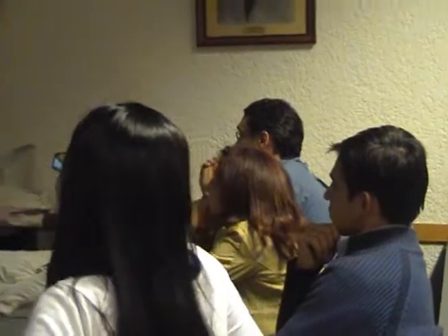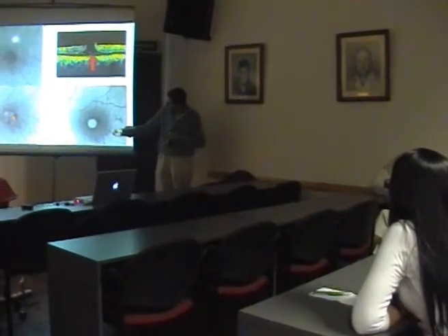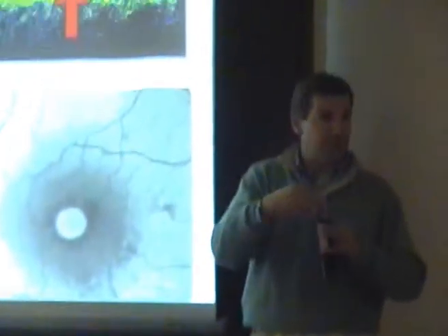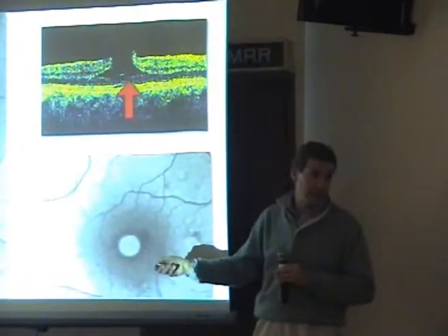So we see directly the fluorescence that comes from the RPE, that is reduced by some tissue here and not reduced by any tissue here. So that is an earlier stage? Yes, you see, it's still some tissue, but that was coming from some cyst that was broken. And by the way, this patient has a 20/20 visual acuity.